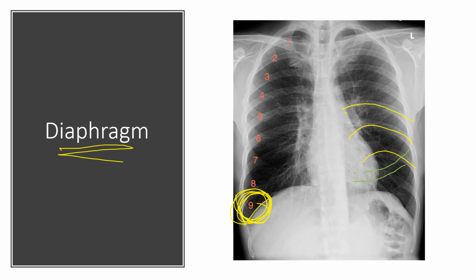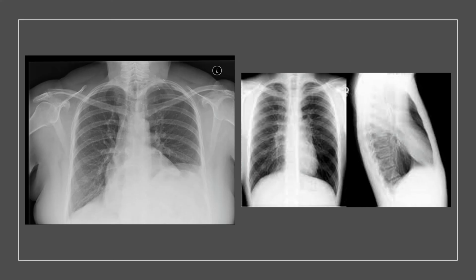So you want to look at the volume. If you only have 6 ribs expanded, obviously, then you would have some sort of big restrictive disease going on. If you had 10 ribs expanded, then that's a sign of hyperinflation. So you have some sort of air trapping, or your settings on your breathing machine are too extreme, right? So that's how it would be to turn down some of those settings. So this is a good sign of seeing a restrictive process or a hyperinflation process.